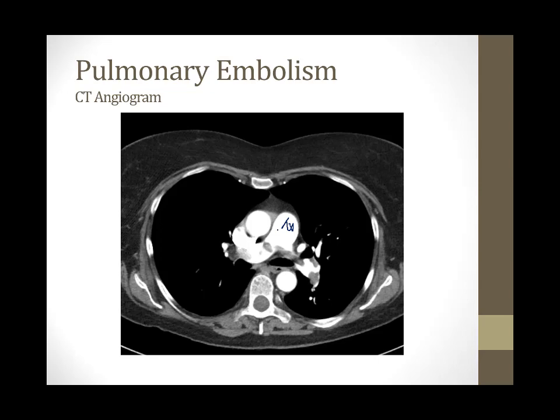Within the pulmonary artery you can see these dark spots right here. That is thrombus lodged in the pulmonary artery, and that is evidence of a pulmonary embolism.